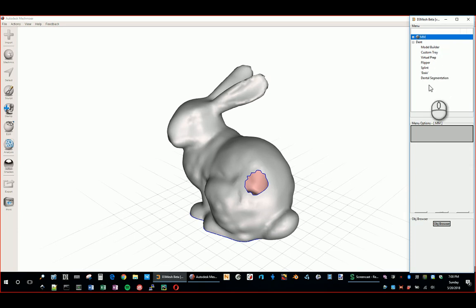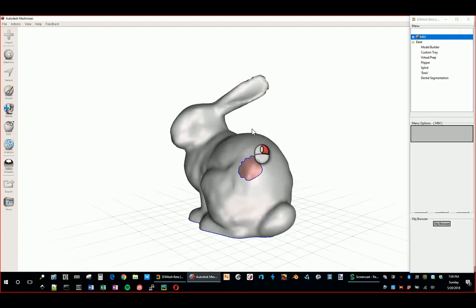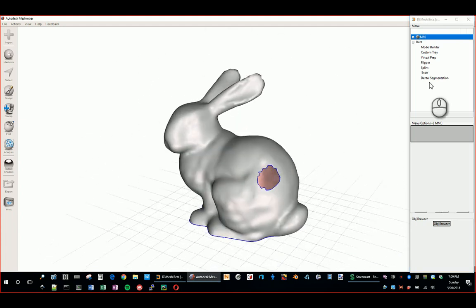Essentially, it's just taking all the steps and parameters and tools that we all know and use already in Mesh Mixer to make models, but it will just do it automatically, and it's so much more efficient. And it's got to be fractions cheaper than the next model builder that I can think of. So I'll just show you how that works in a different video. This is more just the whole application and what's to come and how it's going to be used.